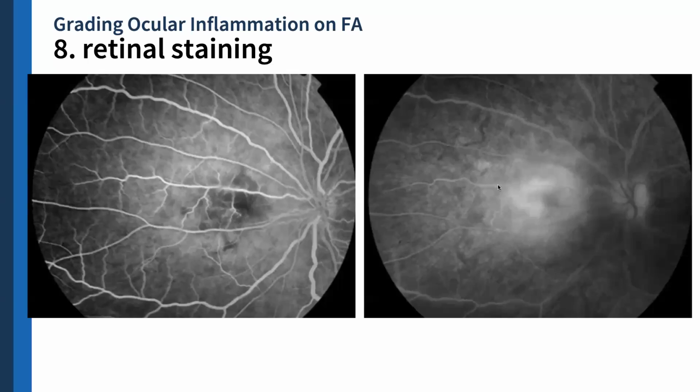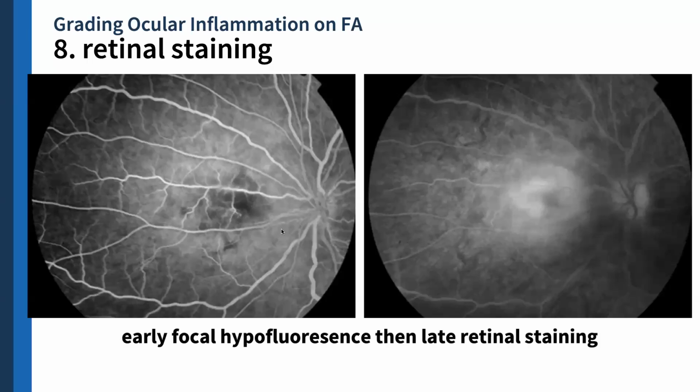Okay. Then lastly, this is similar to what we discussed kanina. So the early hypofluorescence and late hyperfluorescence. So just a warning, when you start reading about these parang entities, you might find na magulo yung description ng mga uveitis specialists. So some would say leakage, some would say staining, and I'm sure my other uveitis colleagues would agree na magulo kasi ang mga uveitis specialists. So and walang universal set of language on how to describe these findings. But essentially, that's why mas safe to say early hypo and late hyper.